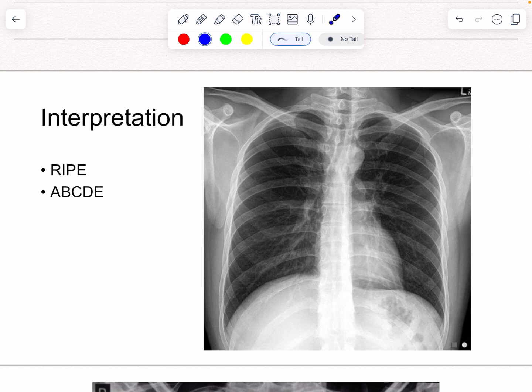Moving on to B, I'm able to see normal lung markings over the lungs, and I will now compare the upper zones, middle zones, and the lower zones, and I'm not able to see any kind of asymmetries or any kind of abnormalities. No consolidation is visible in this chest x-ray. Moving on to circulation, as this is a PA film, I am able to determine the heart size.